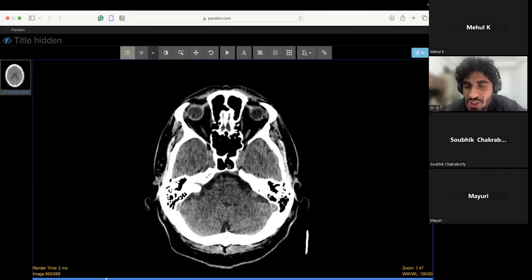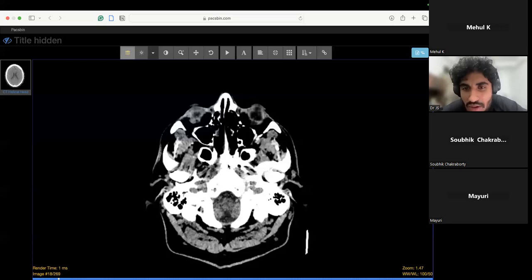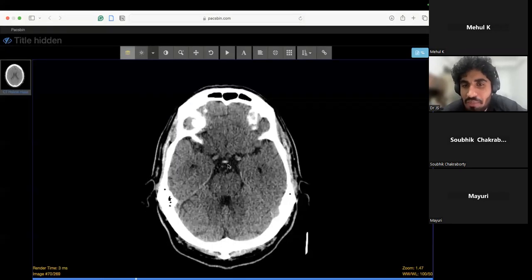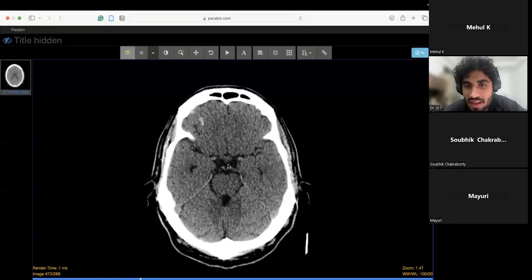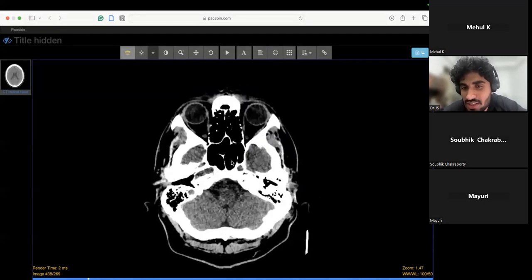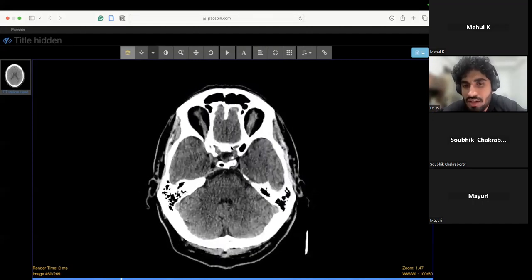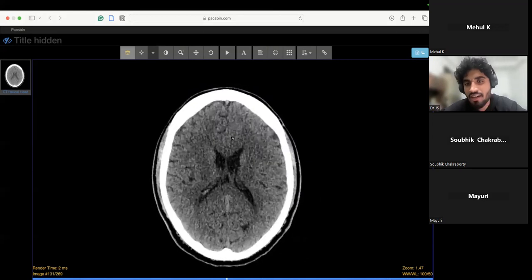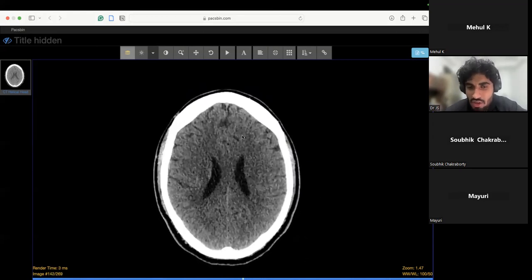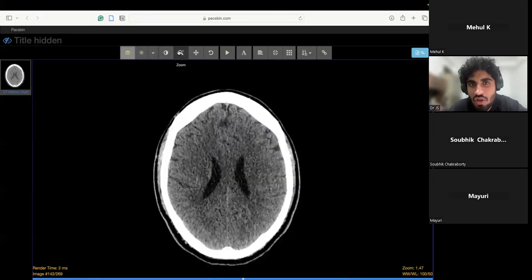There is much more to do actually. I've covered only the basic part, and I did not cover tuberculoma, meningioma, and other things. I have that part as well, but it will be at a higher level. First of all, you need to scroll through these structures and search for PACS bin. You can also search in Radiopaedia, which are freely available. Also adjust this and maneuver around these tools: when to invert, and zoom in.